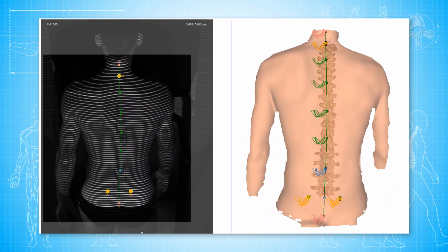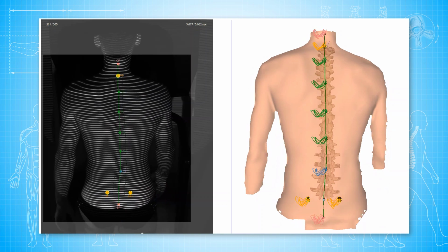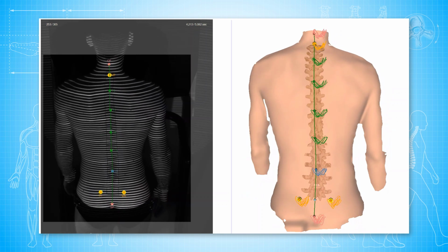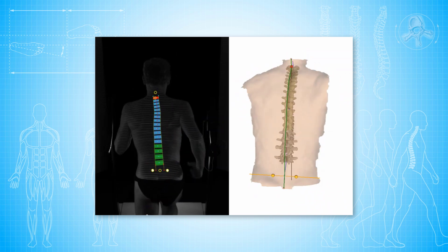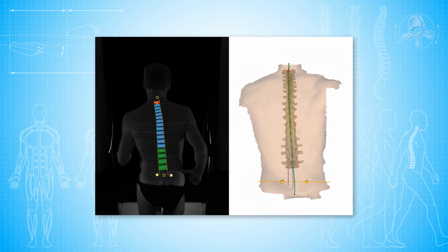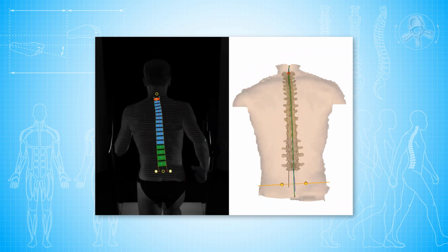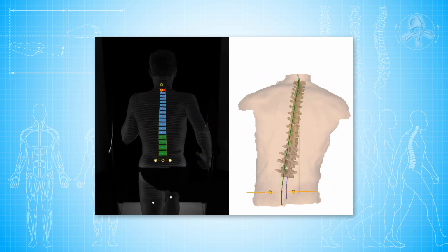In the meantime, the technical possibilities and the associated software solutions are capable of graphically displaying the dynamics of a patient's spine in a smooth and fluid manner, with recording frequencies of up to 240 Hz and ultra-short exposure times of just 4 milliseconds. These parameters even allow for use in high-performance sports with treadmill speeds of up to 30 km an hour.